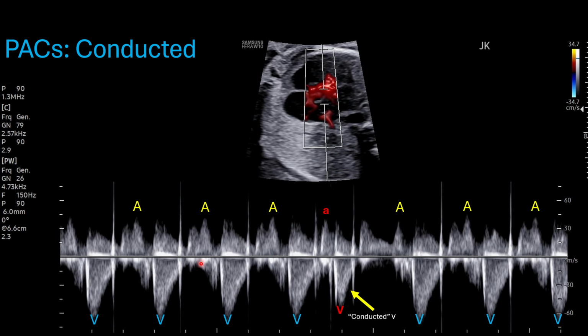And then the mitral valve inflow and aortic valve outflow, LV inflow outflow view here, 5-chamber view with this slightly widened sample volume. You can see here the E, A, this is the A wave. Again, these are all regular conducted PAC with this small V wave.